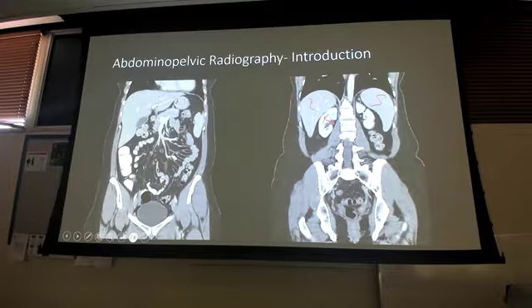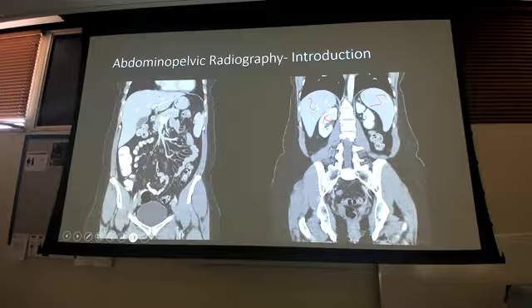So all of these are your vasculature, your mesenteric vasculature coming out and feeding the intestines. So you can scroll through and do all that.